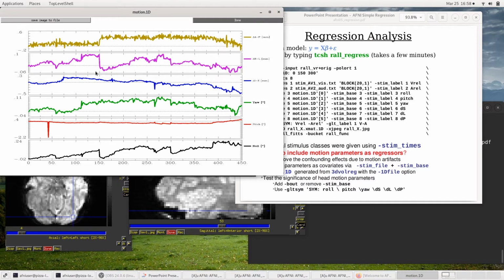You see these big jumps here. That's for a run break. This is 3 runs. So just looking at this, usually there's a registration break across runs as the subject relaxes or shifts their position a little bit when the scanner is off. That's okay. We don't count that really as a motion, as long as they don't move enough to introduce a big distortion difference between the runs. So you wouldn't want to re-shim between the runs. That'll cause the distortion difference. But as long as they didn't move enough where the shimming is messed up, we don't really care too much about these jumps. So we're not going to actually model this.